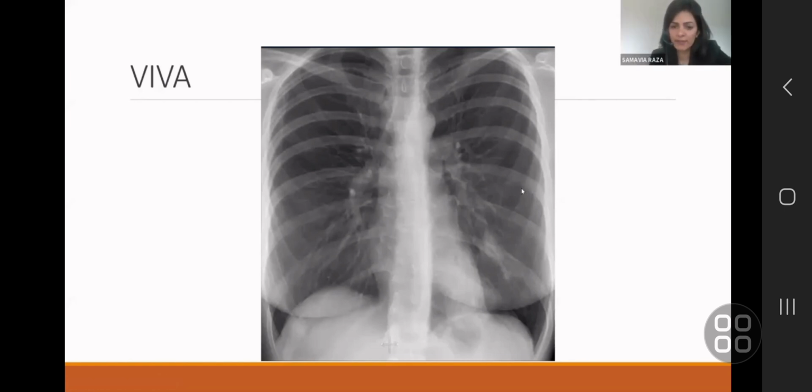All of you are absolutely right. There is something behind the heart on the left. What I would say is be cautious using the word mass on a chest X-ray, because when you use the word mass, you are actually saying cancer, and that's what the referral will tell the patient. They will have a very difficult conversation with the patient if that happens to be not cancer, even though that's good news. That's unnecessary stress. So really try to move away from committing to mass unless it is very clearly a mass. In this case, it's not. It's something behind the heart.